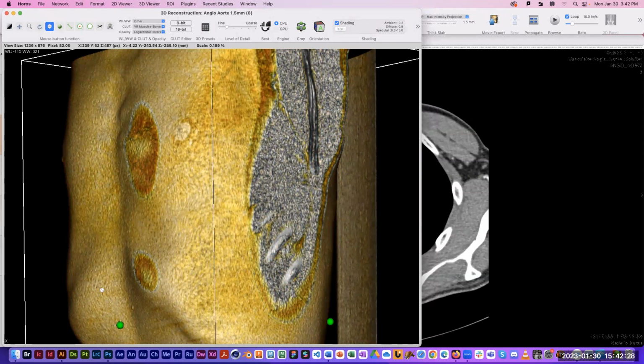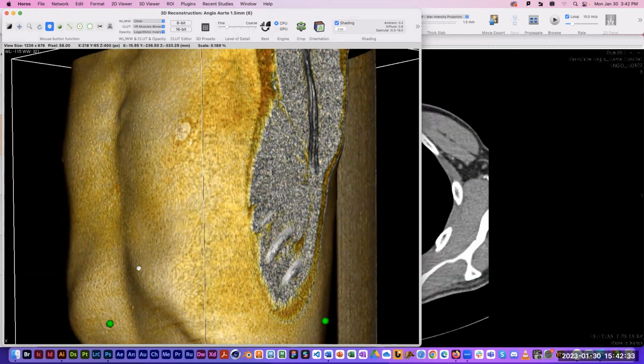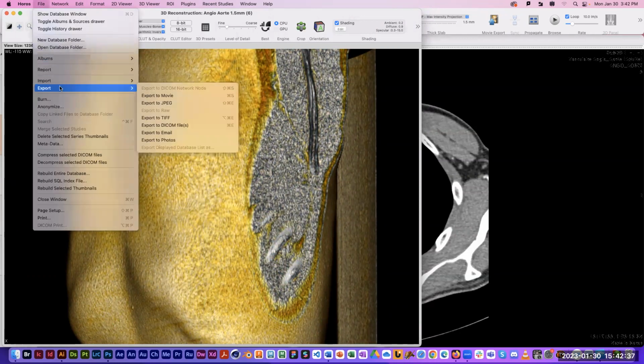And I wonder if it's still cropping some of the skin. Yeah, it still had a little cropping in there. All right, there's my skin. So I'll export one more JPEG for that.